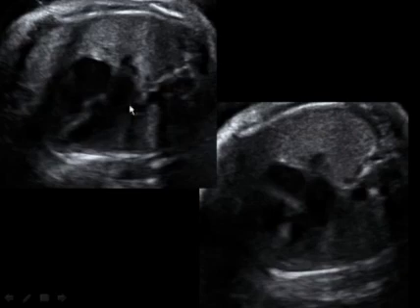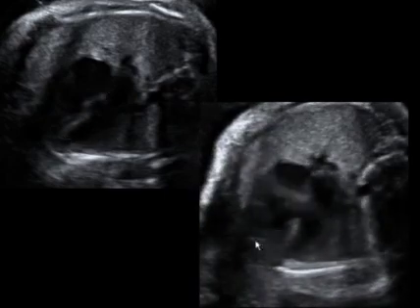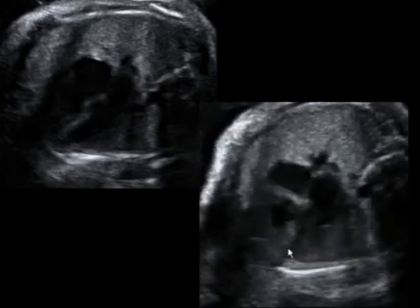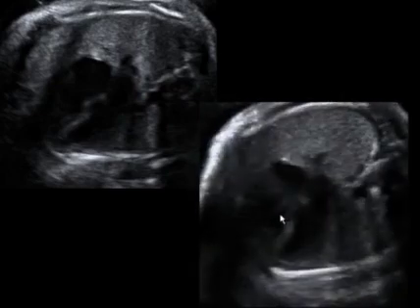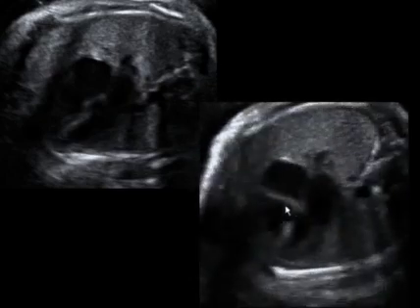Another image of the heart, we see what looks like a beautiful four-chamber view, but remember when you're looking at a four-chamber, a static image is not enough. It looks like we have a beautiful interventricular septum here, but on the clip, I think you can appreciate that the interventricular septum stops, and there is a VSD running right over the top of the septum.